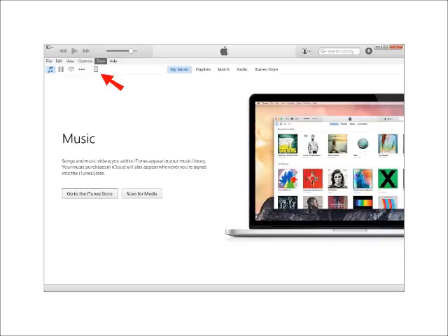The files stored in the iPad can be accessed by Mac or IBM computers. The one shown here is iTunes installed on a Windows 7 PC. So first install iTunes and then plug in your iPad to the PC. The iTunes will launch automatically. Click the place pointed by the red arrow.